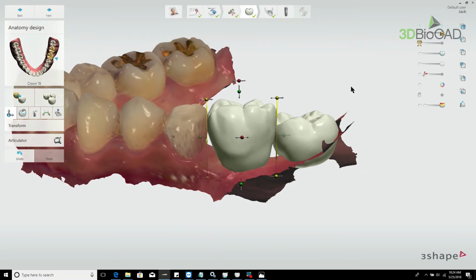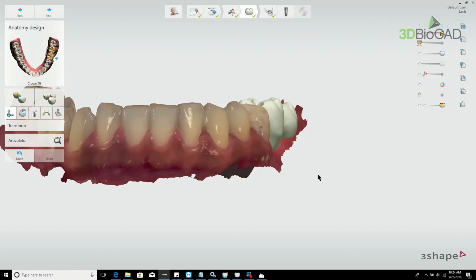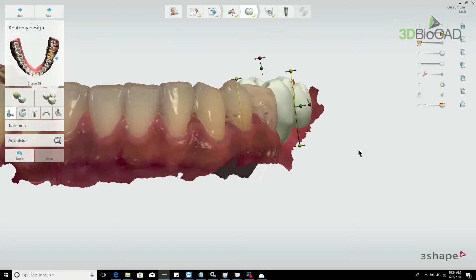So if you already have a dental system, let me show you only one thing that is different in Implant Studio's designing tool. When you use this yellow one in the dental system, we can only open wider on the occlusal side. But in Implant Studio, we have this two-way tool too. So on the gingival cervical side, we can make it smaller and wider too. Okay.